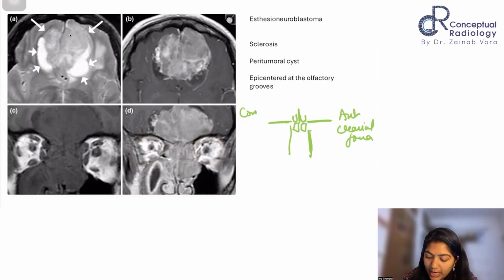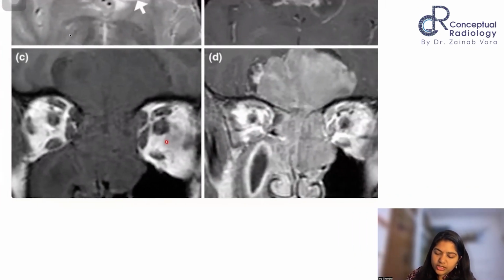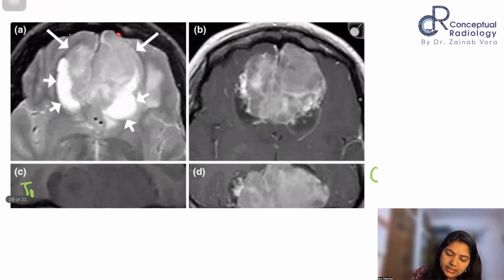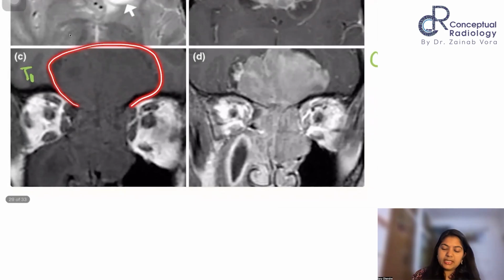And now you have something which is sitting over here, right? If I look at just the T1, okay, this is just the T1. Why am I saying it is the T1? Because whatever brain parenchyma I can see, white matter is white, gray is gray. No sheath which is bright around the optic nerve. So fluid is dark on this sequence. So this is a T1 dark area, okay. And when we see it on an axial T2, we can see that it is pretty bright. Next, we are seeing that it is having an intracranial extension.